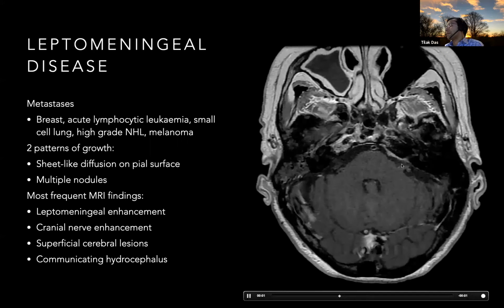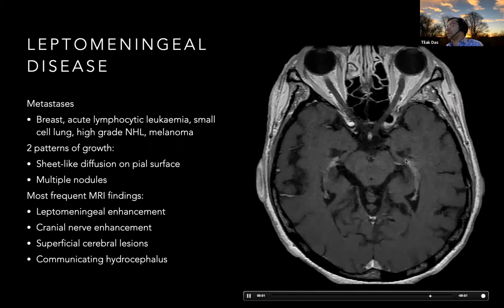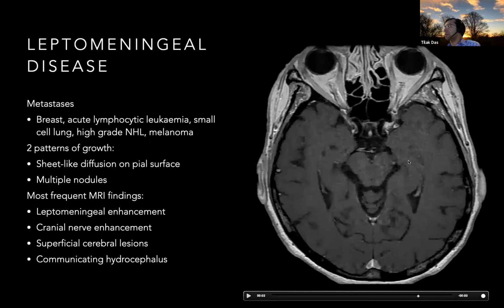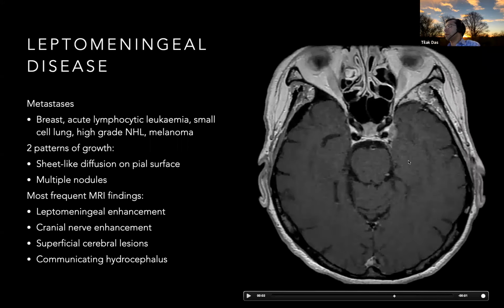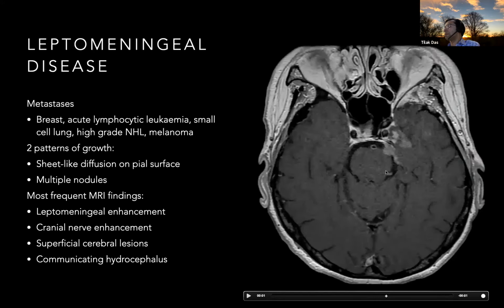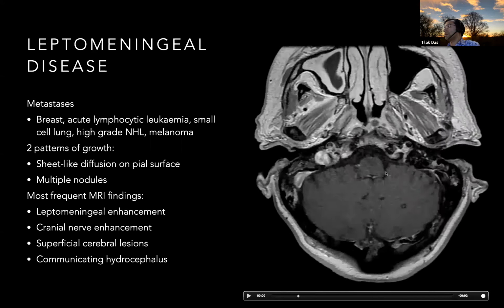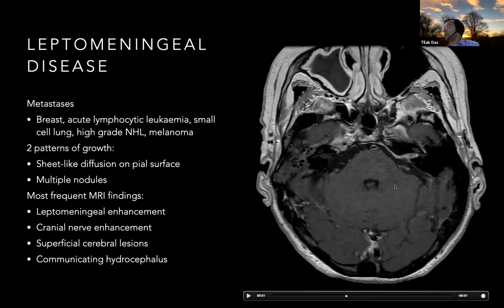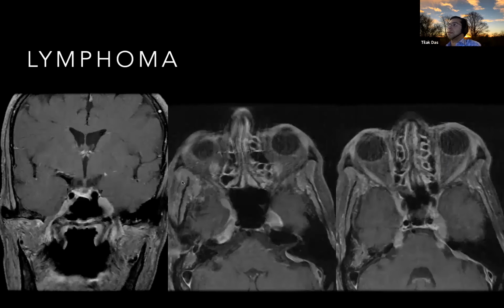Remember, of course, leptomeningeal disease can also involve the cranial nerves. So here you can see a breast cancer with involvement of the IAM on the left, as well as more nodular disease around that area, around the skull base, going into Meckel's cave. And here is an example similarly of lymphoma affecting mainly cranial nerves, but also some leptomeninges with this diffuse, sort of thick enhancing tissue. Here is a very nice example going down the mandibular division through foramen ovale.